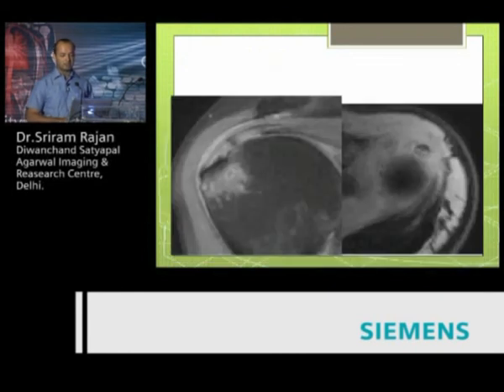This is an interesting case because here you see that's the rotator cable. There appears to be a tear over here, and this could be either an avulsion of the greater tuberosity, but you can't see any cortical fragment. On the actual MEDIC image, you can see that this appears to be an area of calcification. That's calcific tendinitis with tear.